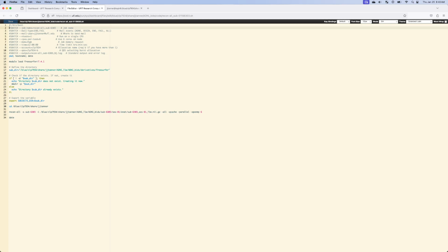The first one, job name. This is whatever you want to call it. You could call it something like cat or hippopotamus or whatever. It doesn't really matter that much, but it's helpful to have it called something that makes sense with your data. So I'm just going to add in the 011S6303. You don't have to do that. This is just a name for HyperGator to have. And then the next line, mail type, and this has an end, comma, fail.